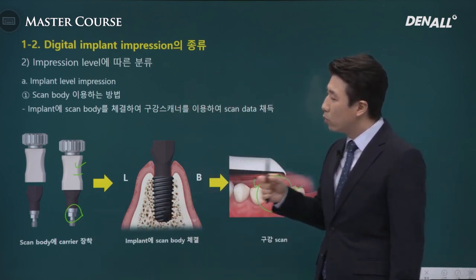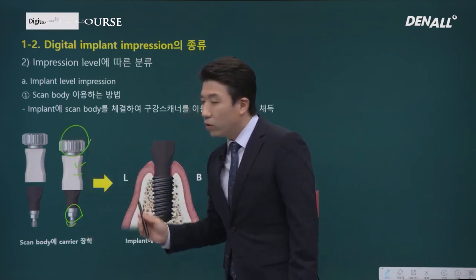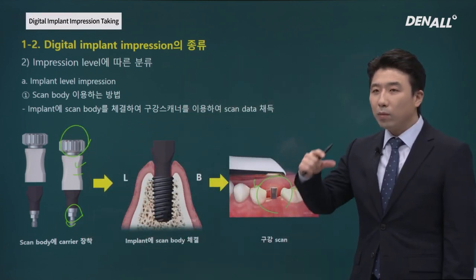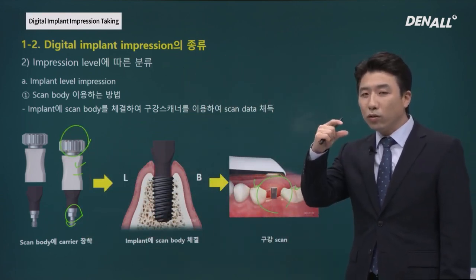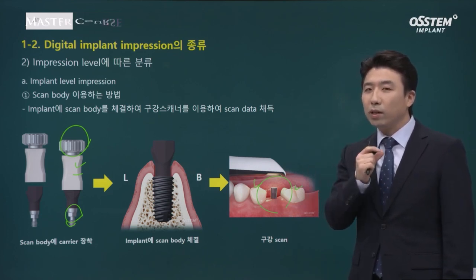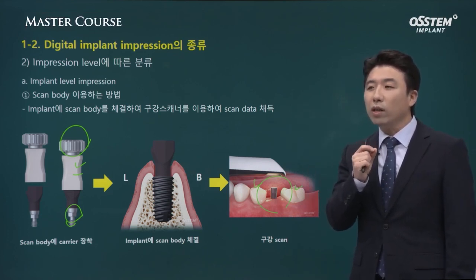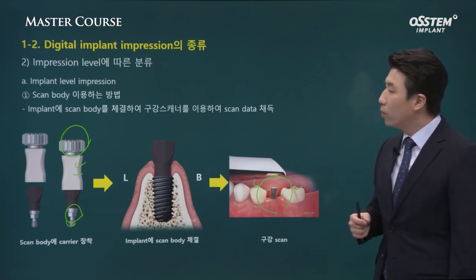And this top part is used to tighten the screw at the bottom. So the scan body hex position is determined, and the scan body screw can be accurately screwed to connect the scan body very stably and accurately. So that is the driver component for that.